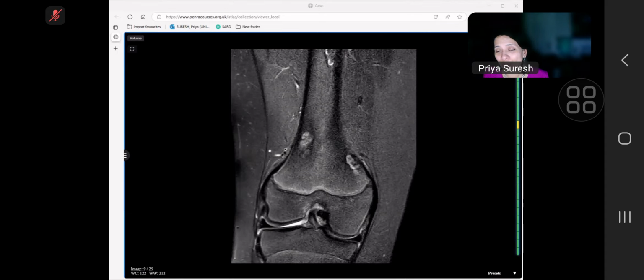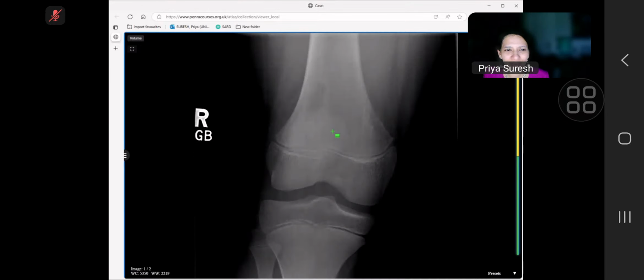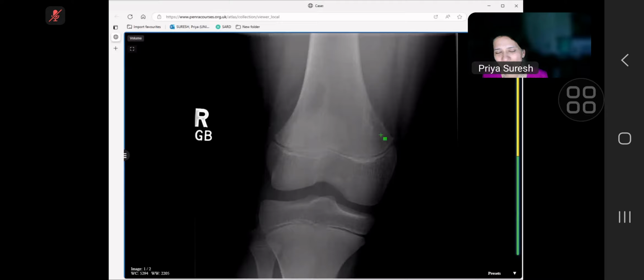You're doing very well. You described it, you immediately saw it, because many people struggle to see it. And then it was cortical based, that's the other thing. I think the candidate number 2 had the brown tumor, so they said, oh, but it looked eccentric. In her case, it wasn't eccentric. From there it looked as if eccentric, but this is definitely cortical based. So brown tumor is not a good fit for this one.